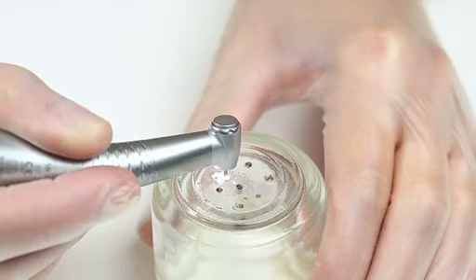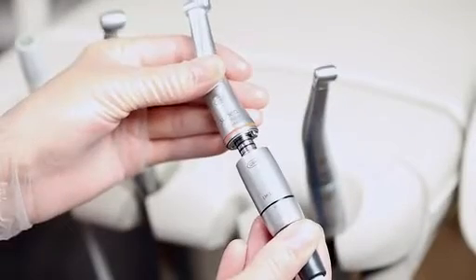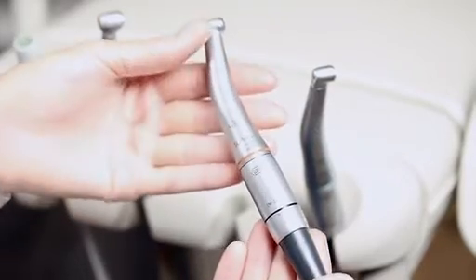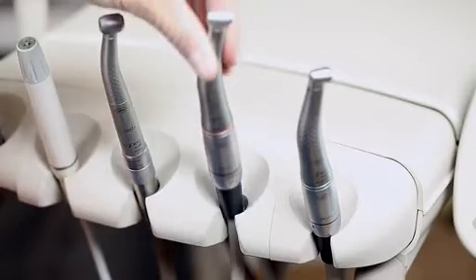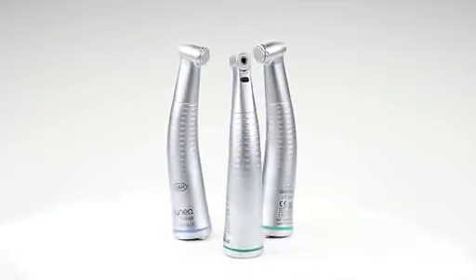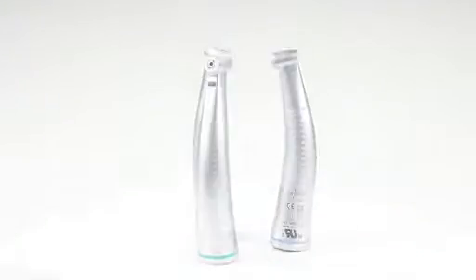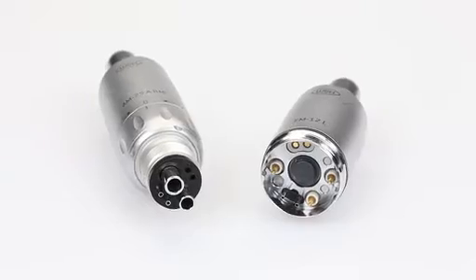They always have enough power, and their operating noise is at least less unpleasant. These contra-angle handpieces must be powered with an electric motor. The entire system is therefore heavier and more costly than an air-driven system. For operating rotary instruments in lower speed ranges, green or blue straight and contra-angle handpieces are used, which can be powered with air or electric motors as desired.